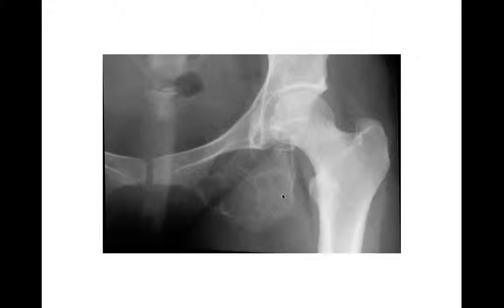Radiograph of the pelvis, coned in here on the left side. We have a geographic lytic expansile lesion. It has these internal septations, a narrow zone of transition, and a non-sclerotic border. It's in the inferior ramus of the left pelvis.